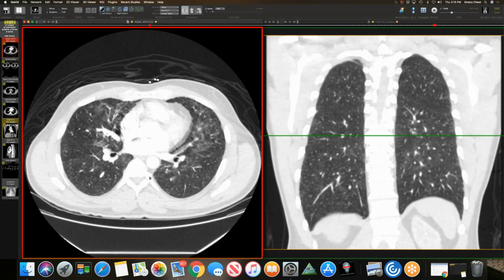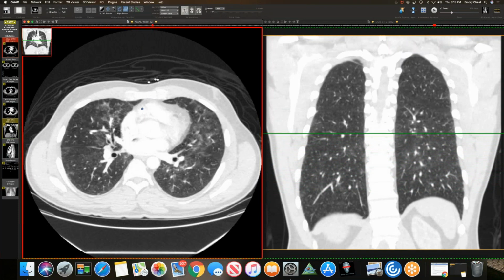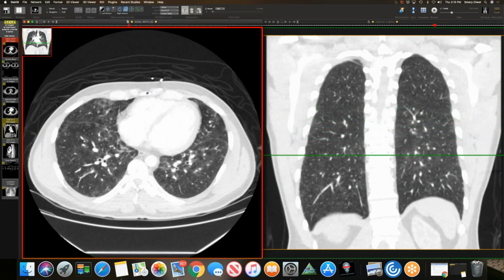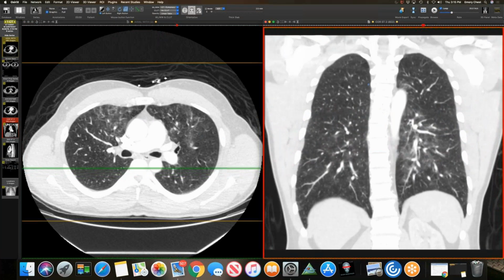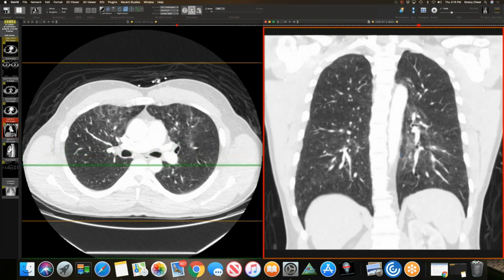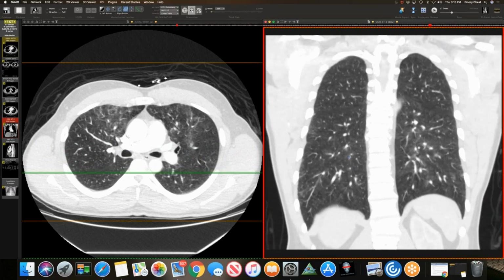And so the findings here we thought were kind of non-specific. There's patchy bronchocentric ground glass. It seems pretty diffuse. Both lung bases and apices are involved, and as you look at the lungs on the coronal, you can notice that there's essentially widespread centrilobular ground glass nodularity that's bronchocentric.